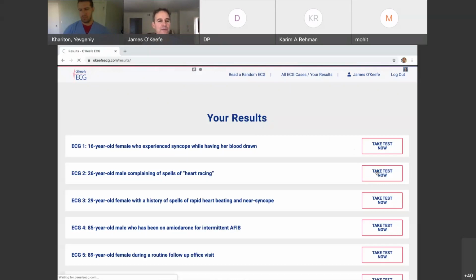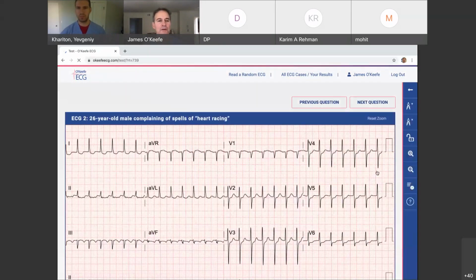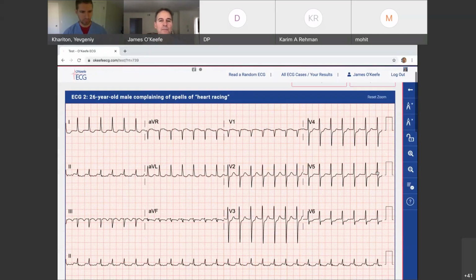This is a 26-year-old male who comes in and complains of heart racing, intermittent heart racing. So anybody want to, and feel free, you don't need to get detailed about it, but it's fun to just put your bet down, and then we can discuss it. Anybody want to chime in on this one?